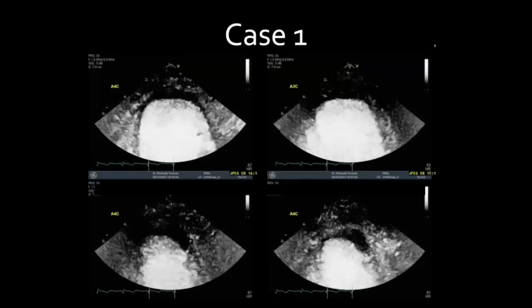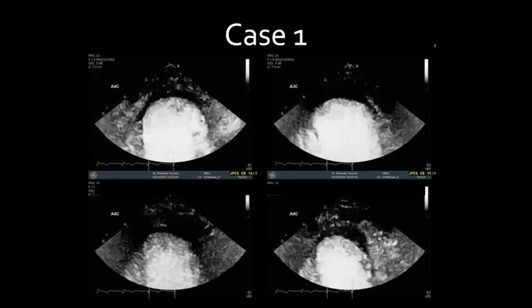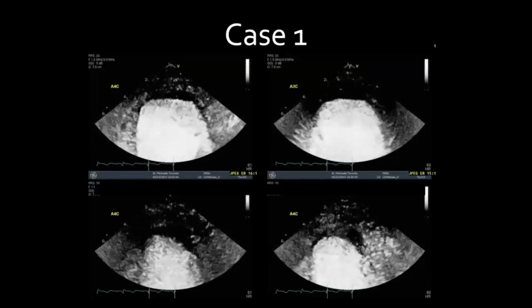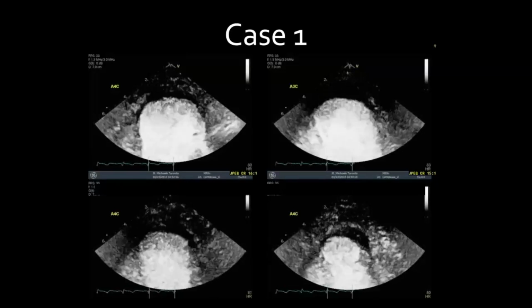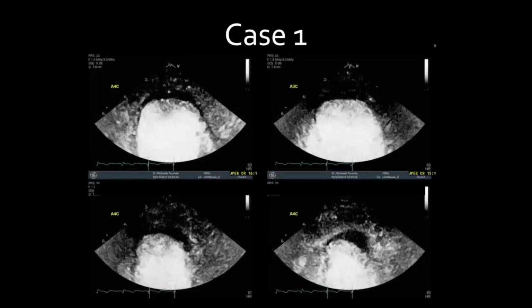We want good homogeneous opacification of contrast within the left ventricular cavity, and we want to see the endocardial border as well. On top of that, we ask them to do zoomed views, especially if there are apical abnormalities, ideally about a third, maybe up to half the left ventricle.